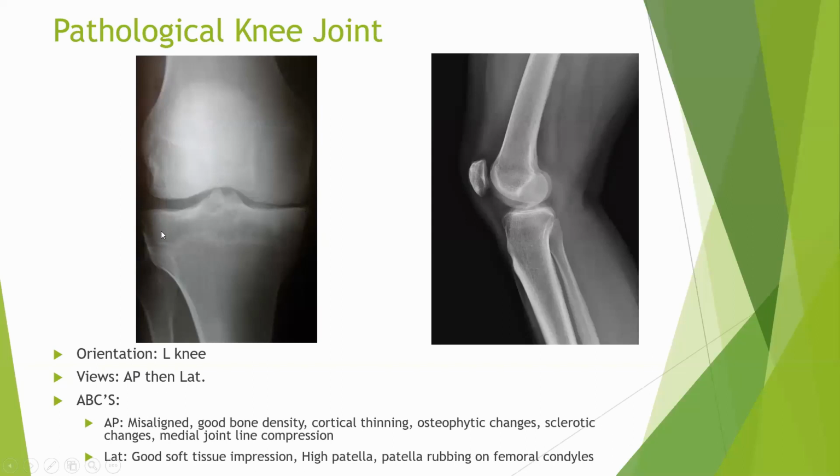They are not. In fact, as you can notice, the tibial lateral condyle is a little bit laterally pointing out, and the femoral medial condyle is actually forced medially. So there is a misalignment or malalignment within the joint.